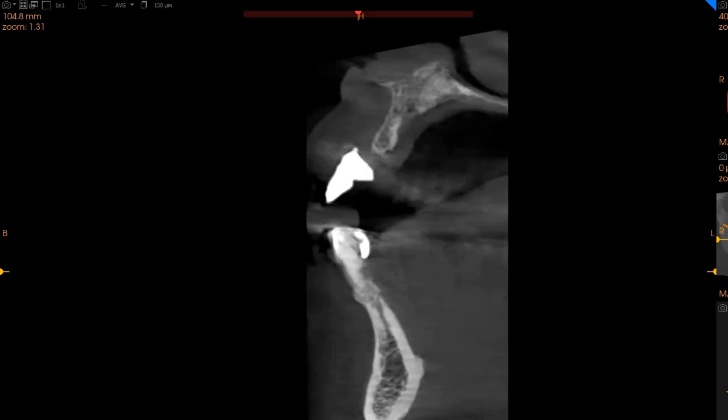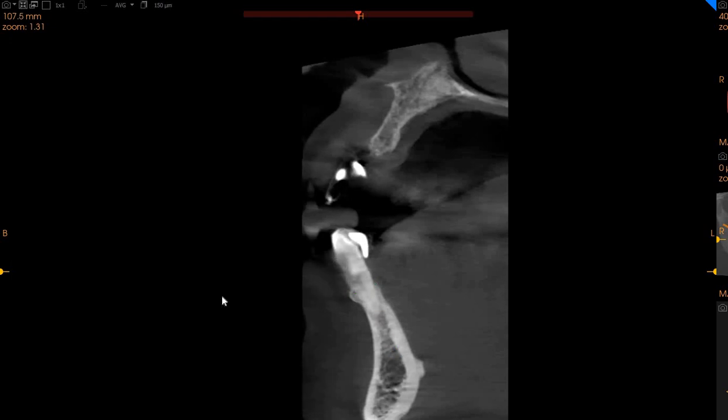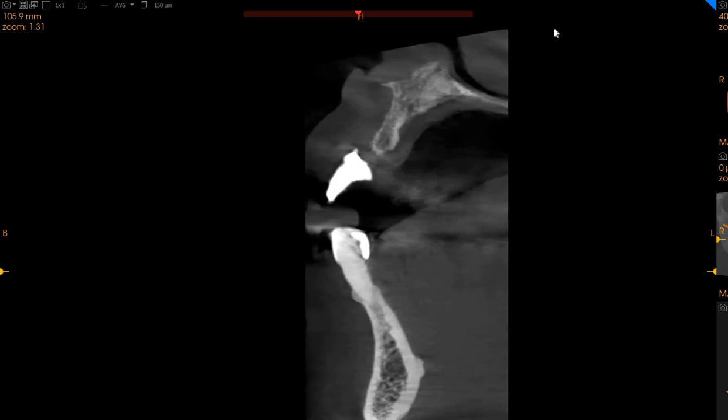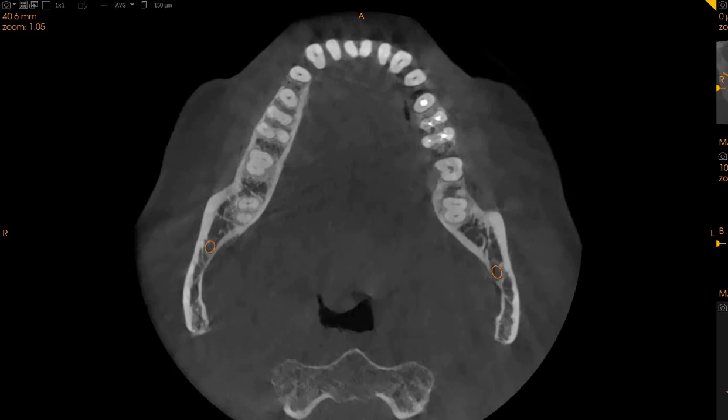And then this is the lateral incisor on the left hand side. Again, severely periodontally compromised, better bone than the canines, but again, very compromised, 6 millimeters of width with 15 millimeters of height. All these teeth, the lower lateral incisor actually shows quite some sclerosis.